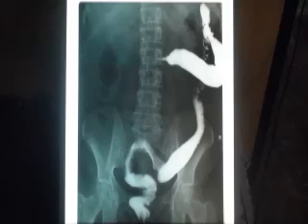This is also barium enema, showing arrest of the dye in the transverse colon with shouldering and destruction of the mucosa and failure of the dye to pass to the ascending colon. It's an obstructed cancer colon. But we have to notice that the rest of the sigmoid colon and transverse colon have a strange pattern. This is loss of normal haustration. This is not the normal haustration of the colon.